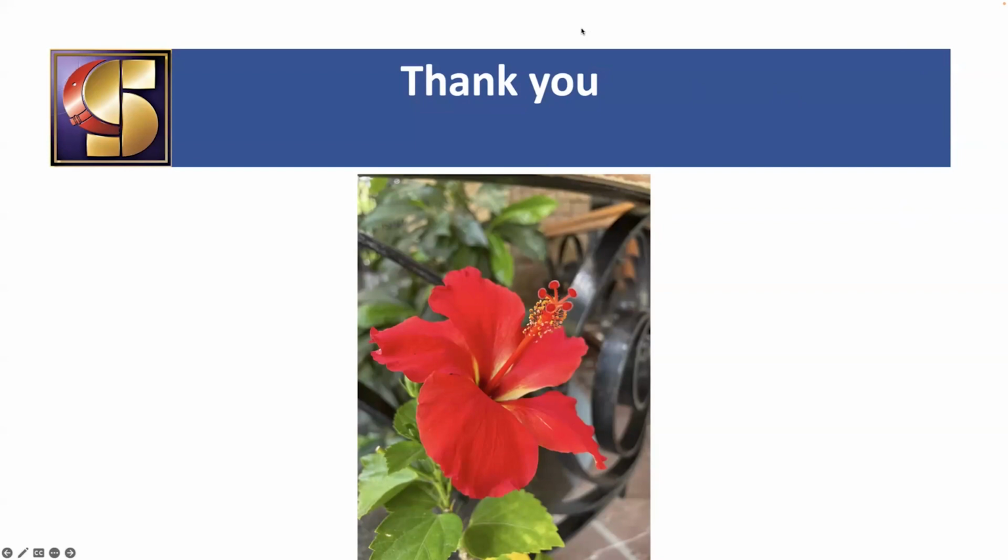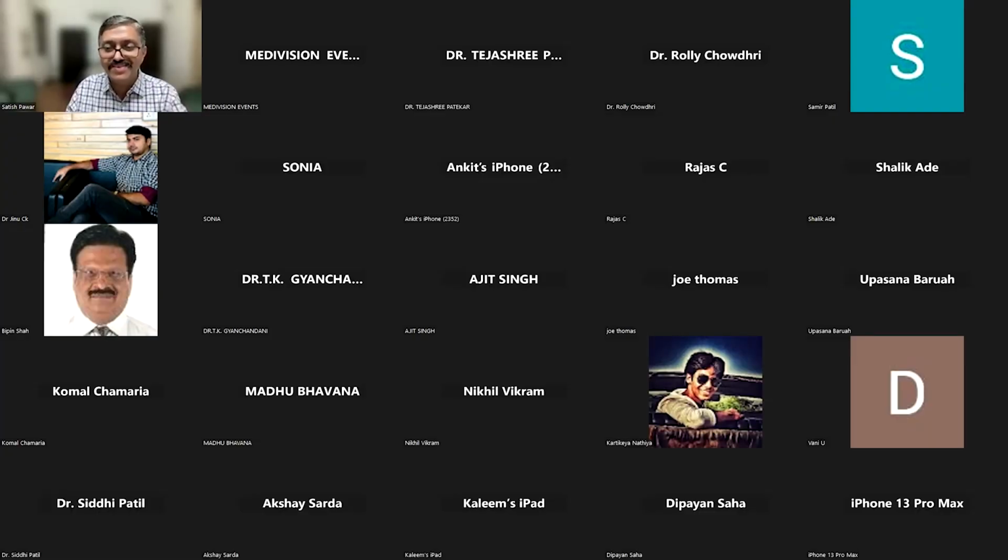Thank you so much, Dr. Satish. Nowadays, in every alternate case of TKR, we can easily evaluate, at least for lateral and posterolateral knee pain, and it is very easy. I think it should help all of you. At least we can see the popliteus in a better way. Yes, superb. Thank you, sir.